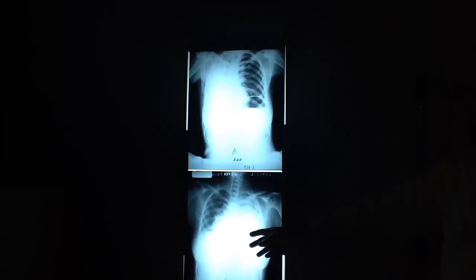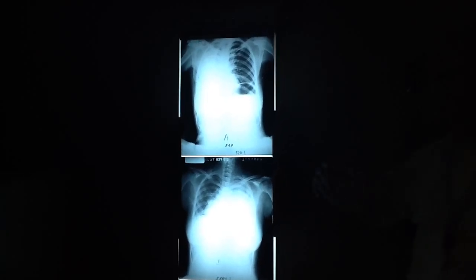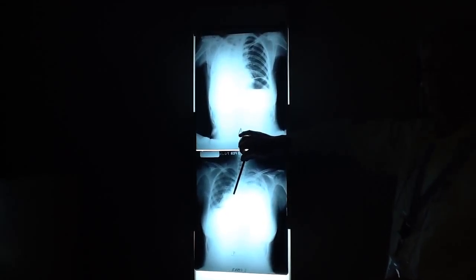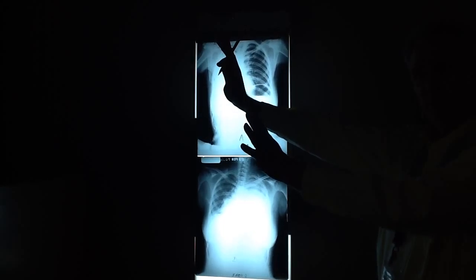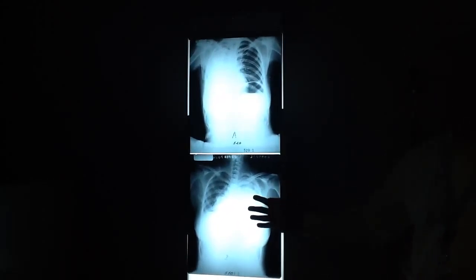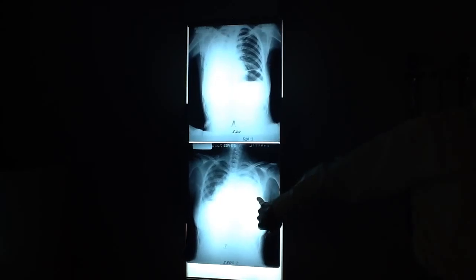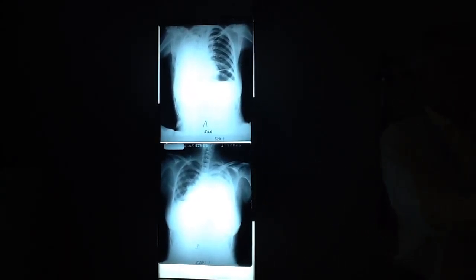Now, both of these, the patient has atelectasis. But in one it went toward. There's the trachea. In the other it goes away. So this one, when everything's moving toward, is resorption. When things are moving away, something's getting bigger and expanding. And this is the same problem as far as the lung is concerned. It's just different what's causing the lung to collapse.